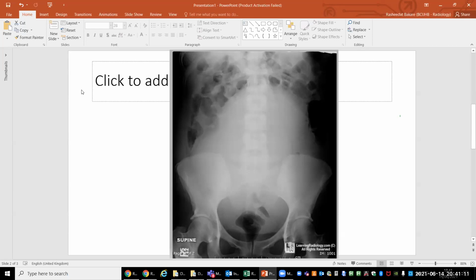What if this patient is male? If this patient is male, I would be thinking of, because this is intraperitoneal in location, maybe a large, very unlikely, but a very large distended urinary bladder or a tumor arising from the urinary bladder. What if it is not arising from the pelvis? Then it could be a large mesenteric cyst. What would you do next? I would do a CT abdomen in that case, contrast enhanced CT abdomen.